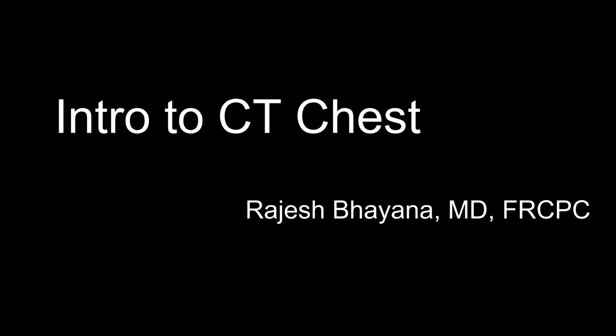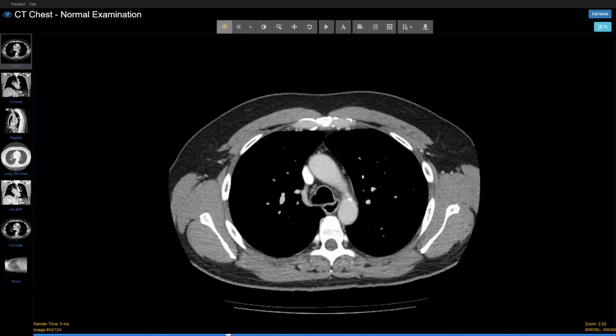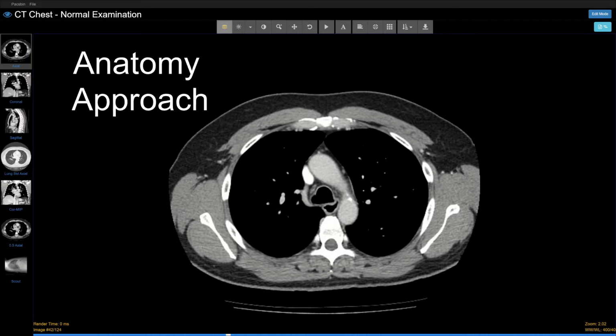This interactive video series is designed to get you comfortable reading CT scans of the chest. By interactive, I mean that you'll be able to scroll through full CT cases on your phone or computer as you follow along. In this first video, we'll cover basic anatomy and an approach to reading CT of the chest.